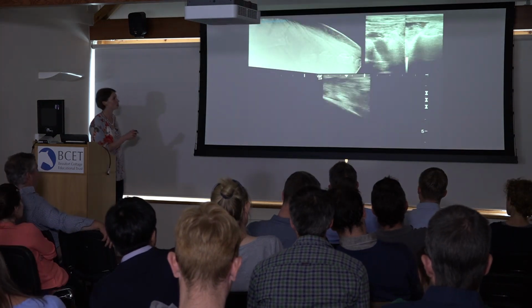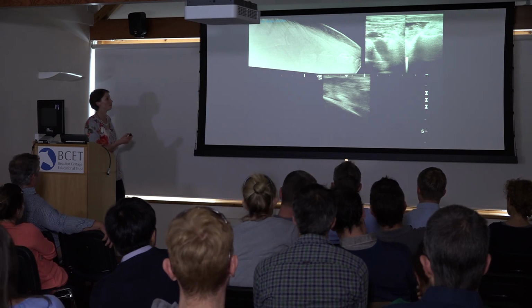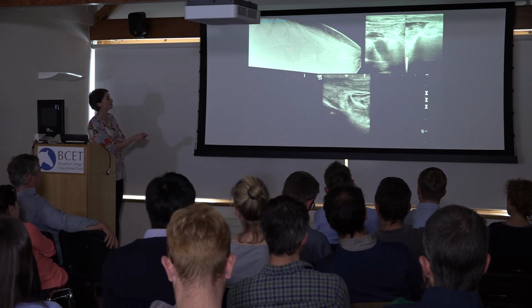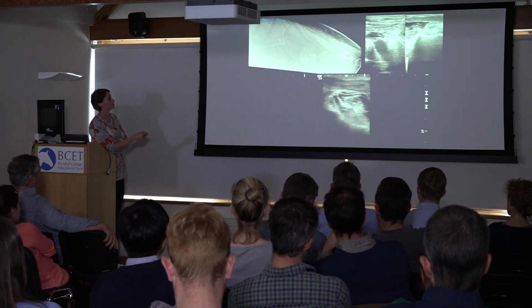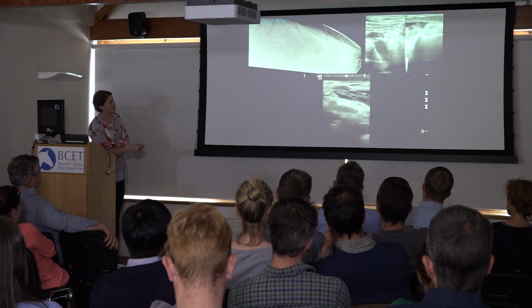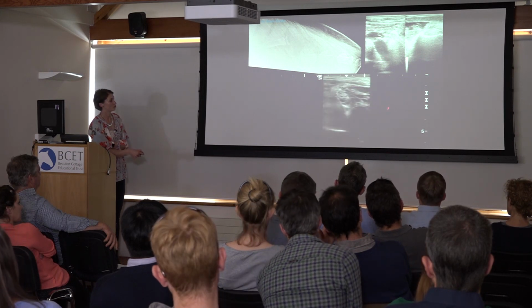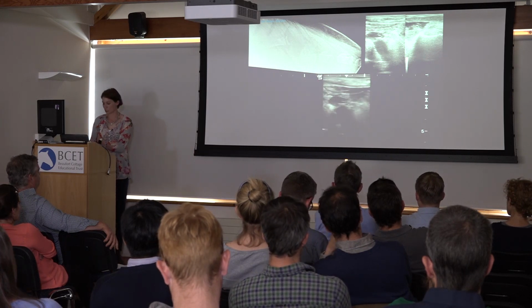So this was a horse that actually presented with a rectal impaction, so it presented as a colic to the hospital as an emergency, and it had sustained a fall. Essentially what we can see radiographically is a fracture of the first coccygeal vertebra here, with complete displacement of the coccygeal vertebra compared to the sacrum. There's huge disparity with respect to the bones here, and obviously a significant amount of associated soft tissue swelling as well. So we can get a very good appreciation of those rectally.